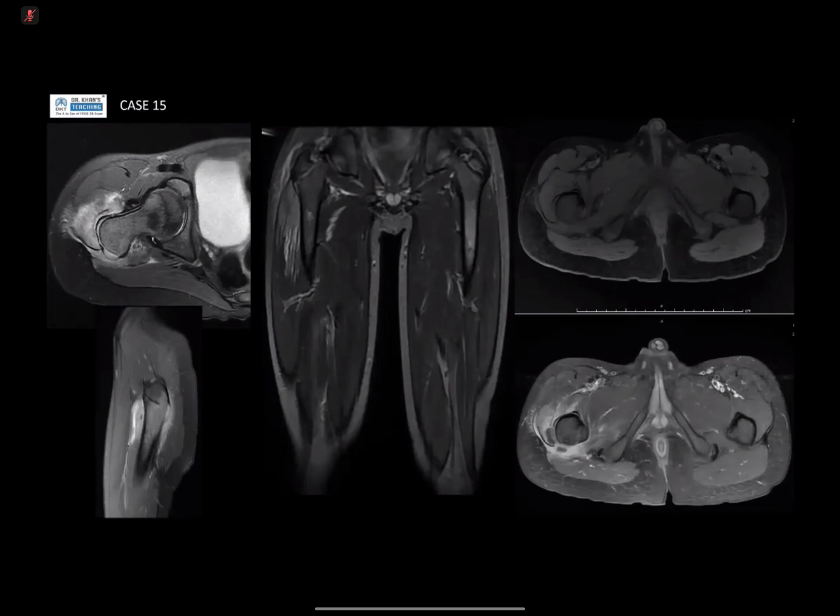Can I have a clinical history of the patient, please? Right leg pain. Does he have fever or anything? Yeah, he's got a fever. ESR elevated. CRP is 70, white cell count 25. Findings are suggestive of an infectious process like osteomyelitis, and this is most likely an aggressive appearance as infectious osteomyelitis and abscess.